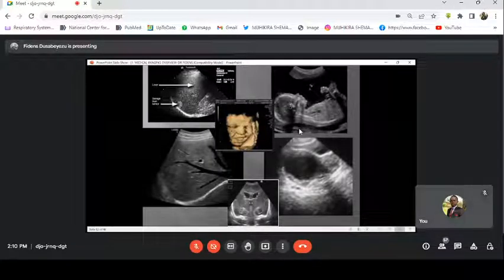All right. Going to the last image here, this is transcranial, transfrontal ultrasound, where you see the brain and the ventricles. This is a neonate. These are the ventricles, posterior horns, the third ventricle, and you can see that always posterior to a cystic, dark structure, there is whitish behind. That is posterior acoustic enhancement. Even here, because there is a ventricle here, posterior to it there is enhancement of sound waves. Even here, enhancement of sound waves, because in the third ventricle there are some calcifications, even for the neonate. Behind it there is this darkness, this shadow. That's posterior acoustic shadowing.